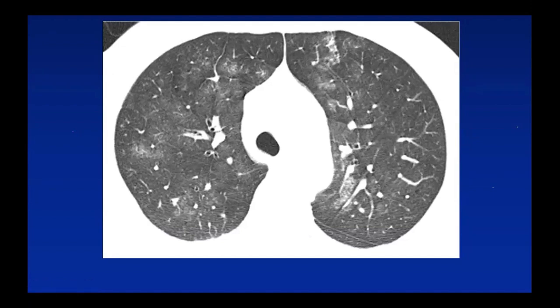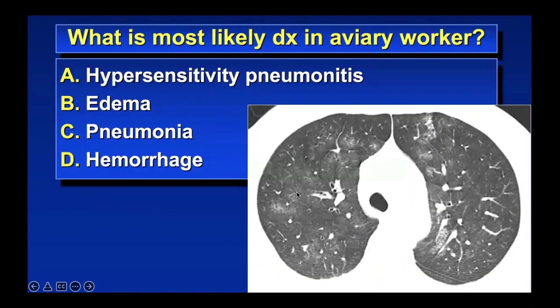And it seems like you should be able to tell, but we can't really tell which is abnormal and which is normal just by looking at the white versus the dark, because sometimes mosaic attenuation and ground glass opacity look very similar. So don't just say this is denser, so it's ground glass opacity. It may be in fact normal and this darker area is abnormal, so it's mosaic attenuation. So in this patient, I cannot define the edges. In other words, if I had a pencil, I couldn't draw the edges here. So I would say this is patchy ground glass opacity.